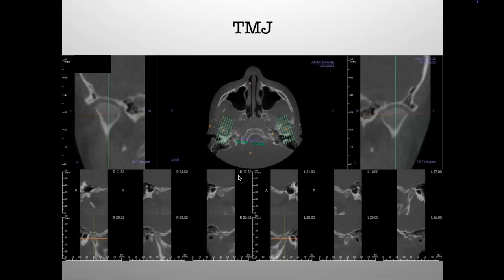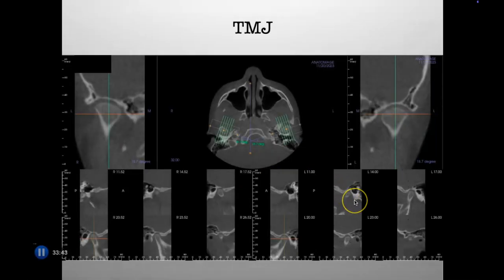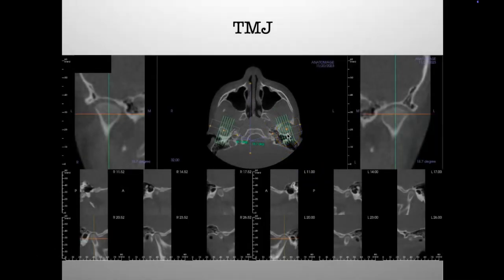Okay, so two different things. Wear pattern. So the fully seated is what I was going for initially, right? So we were suspecting that this patient was shifting to the right side based on all the information that we had before. So when we look at this image here, we would expect to see the left side condyle where? More anterior, right? So when we look here, anterior, posterior, and these are different sections. You can see all the sections here. It's going all the way across. And so anterior, posterior, and then that's the right side. When you look at the right side compared to the left side, is there an obvious difference in the position of the condyle? No, there's not.